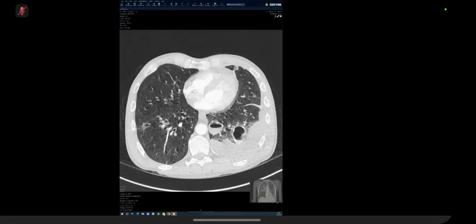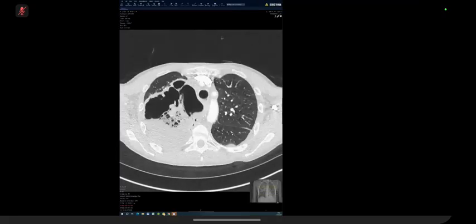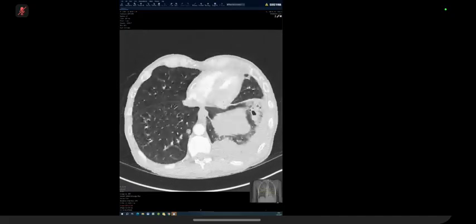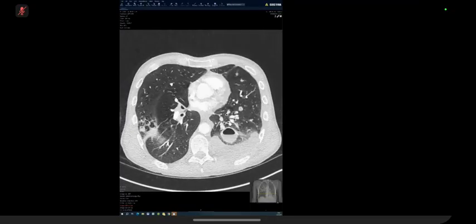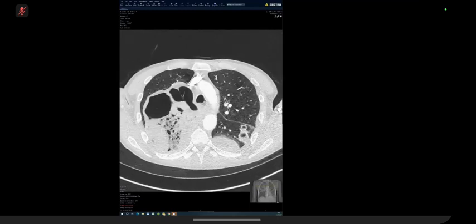One of the differential diagnoses, in the context of fluid levels within, may be multiple abscesses, maybe septic emboli with the complication of flaring of the infection, maybe Wegener's granulomatosis. However, the typical course of Wegener's doesn't go aggressive like this. The lesion in the right lung is so large, so my differential diagnosis includes multiple abscesses, multiple septic emboli.